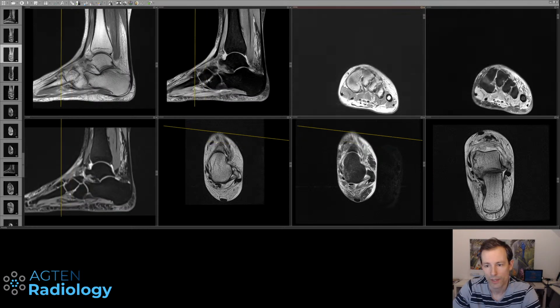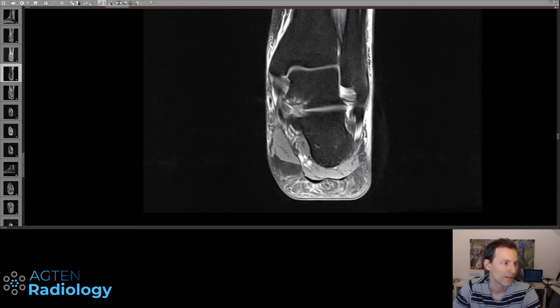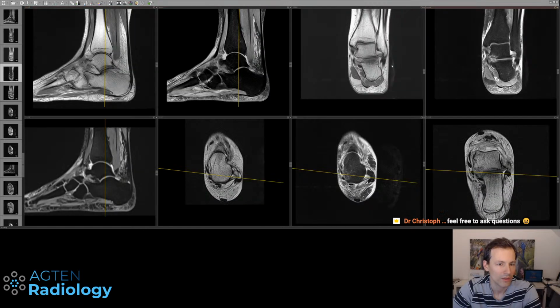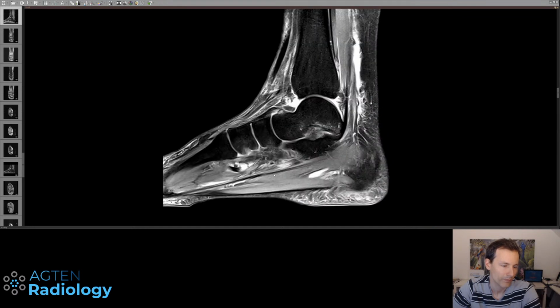And then lastly, you can describe any soft tissue edemas you can see here. Just one thing I'd like to mention. There's not a lot of swelling going on here on the lateral side especially, but if you look how straight the skin is lined up here, it's because they stuffed this coil pretty well with material. So it's quite flat. Probably a lot of the swelling is not visible now, but if the swelling is not so pronounced here, it also indicates that the injury might not primarily have been the lateral ankle ligaments, because in this specific patient the injury was in the Chopart line, which is a little bit more anterior, right?